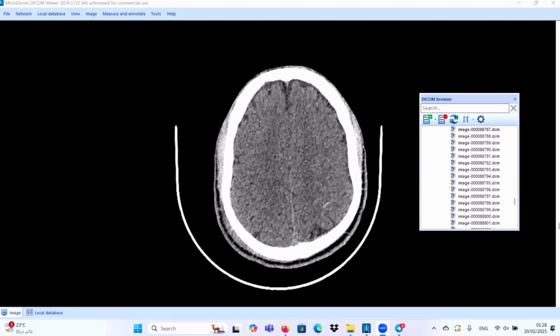This sometimes explains why the patient is comatose, why there is a discrepancy between the radiological finding of the CT brain and the clinical situation of the patient. This discrepancy can be explained by diffuse axonal injury, which is not visible in the CT brain and easily visible in the MRI study. In this case, we can detect petechial hemorrhage very easily.